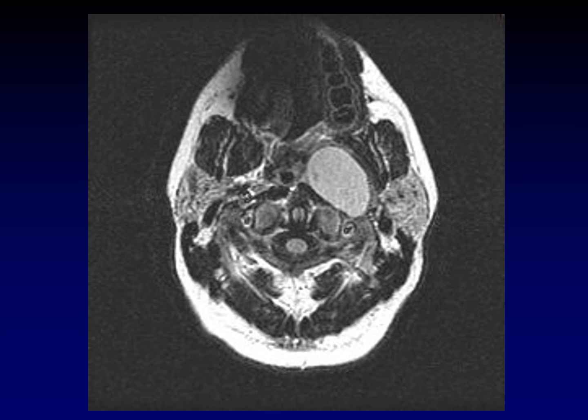But that's not the only place that we can get second branchial cleft cysts. The second most common location for a second branchial cleft cyst is in the parapharyngeal fat. Now, normally when we're talking about the parapharyngeal fat, we're talking about all the different spaces around it. It's a marker for our differential diagnosis to help us figure out where the lesion came from based on how it displaces the parapharyngeal fat. A lot more on that in the anatomy of the neck lecture.